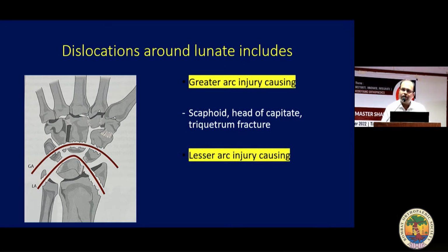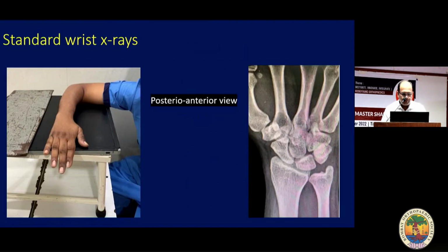And then there are lesser arc injuries. Usually they involve only radial styloid and ulnar styloid fractures, and the mechanism of force travels between the capitate and lunate. So these are the two important arcs that we should try to see on the wrist posterior anterior view X-ray.